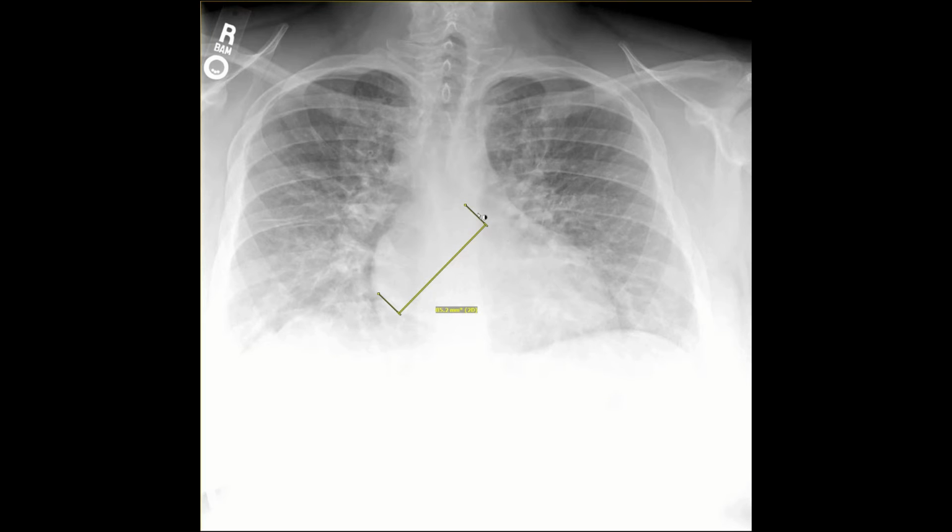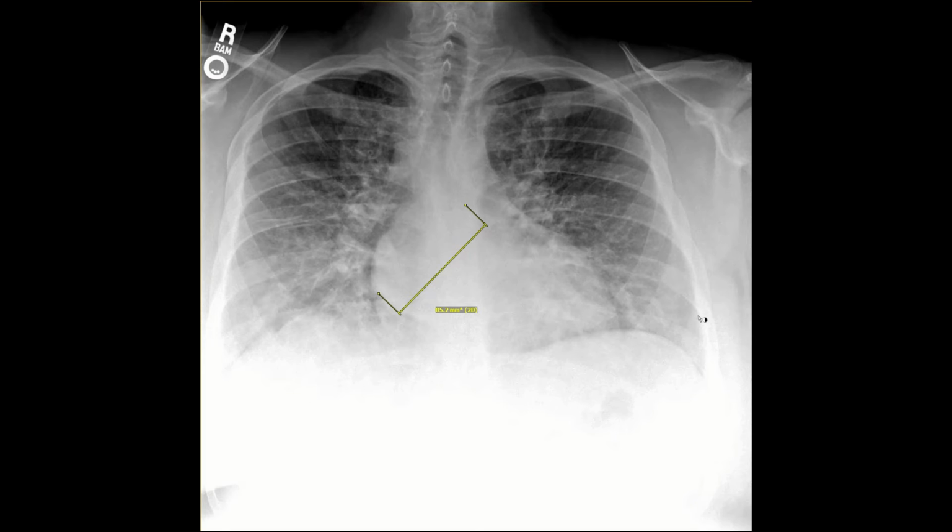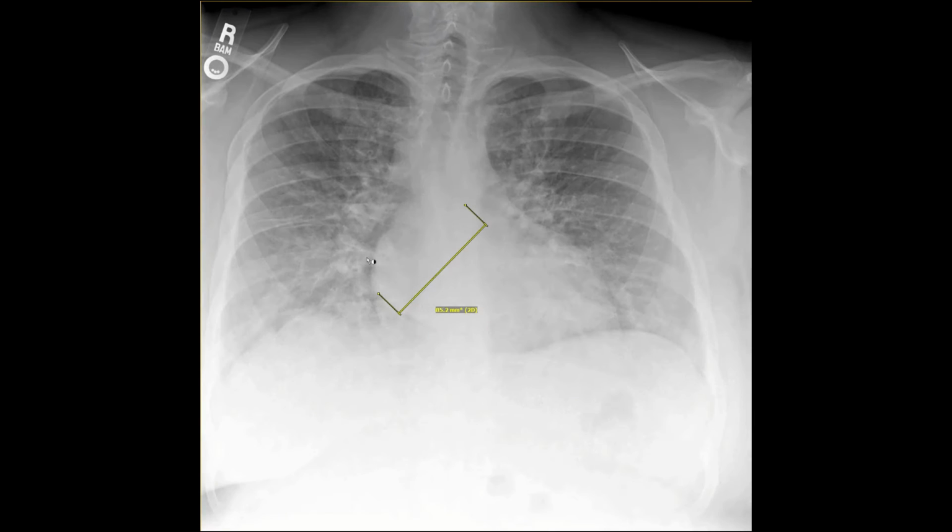These are some curly lines, and you can actually see them out in the periphery of the lung as well. If I play with the window, look down here. Here's an extra line that doesn't belong, a couple little extra lines. Some of these you have to hallucinate, or you have to have a lot of practice as a radiologist. But this patient's not doing too well, right? To me, this screams of heart failure.